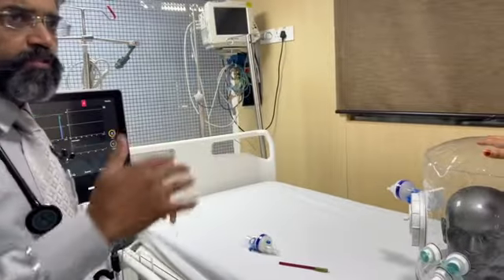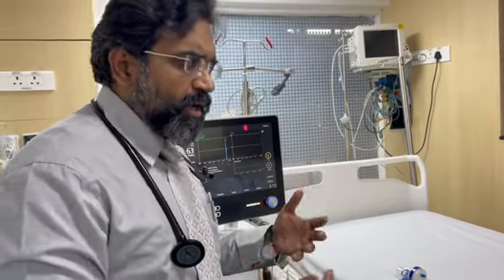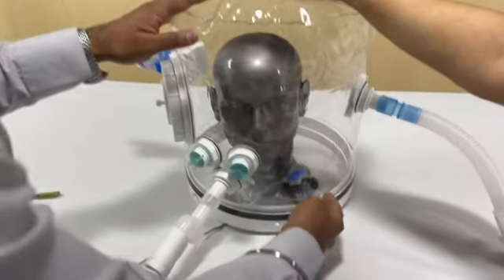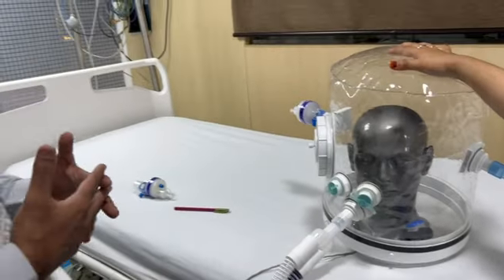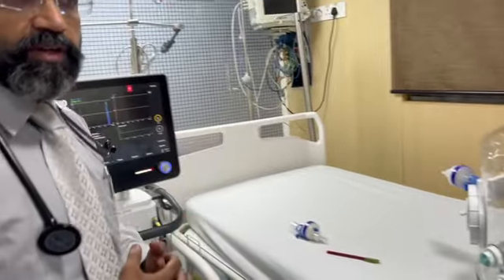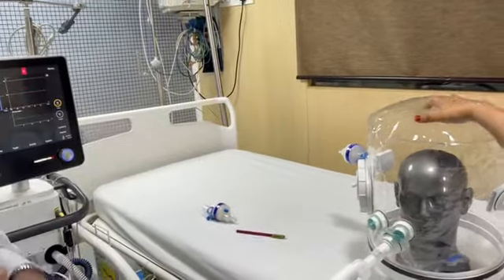That means you need two levels of pressure. You can't just have one level of pressure over there, because these patients may then accumulate carbon dioxide. Similarly, as we described later on, we would use the EtCO2 to be placed over there. It could be side stream, it could be mainstream. You can just place it over there. And similarly, if there is an increase in the carbon dioxide by more than 5 on your capnometry, you can actually put oxygen from here and then wash out that carbon dioxide that's coming in over here. You could put a flow of gas or oxygen, whatever you want, from here at 8 to 10 liters and let it wash out the carbon dioxide and then follow up with the ABG.